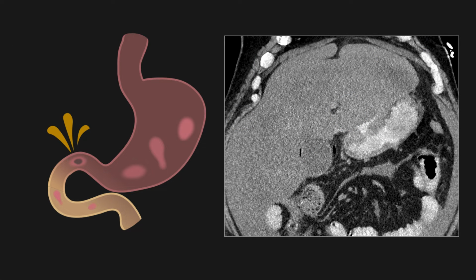Oral contrast can be great for helping you locate the perforated ulcer and should be considered for your initial exam or for problem-solving challenging cases. It is helpful if the patient is even able to drink a small amount of contrast. In this case, contrast is leaking through this antral defect and coating the liver edge, helping us to make a confident diagnosis about the location of the perforation.